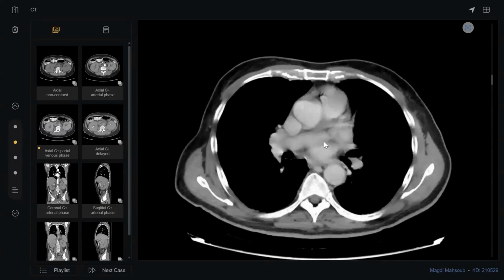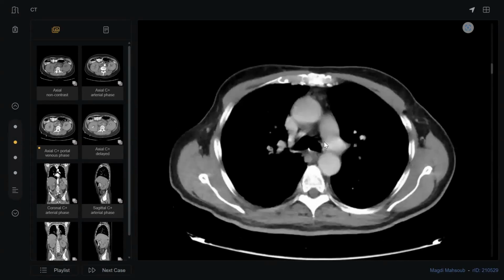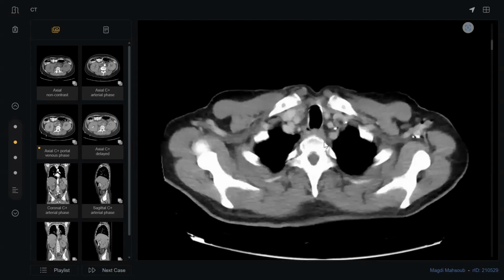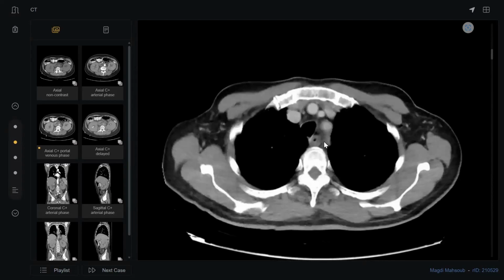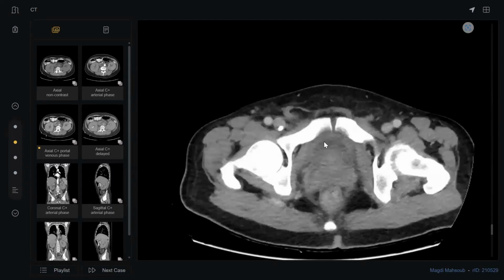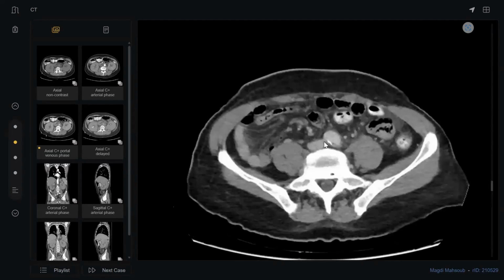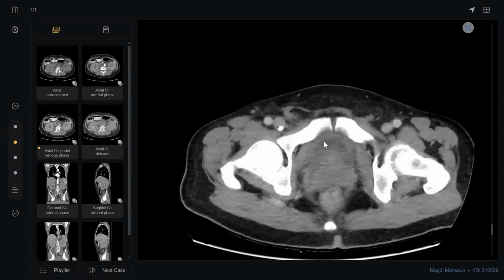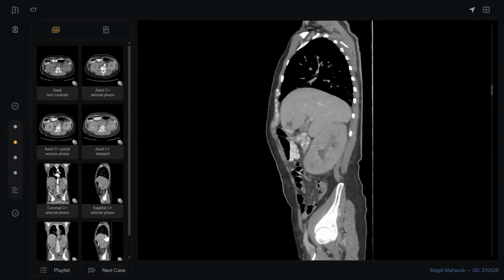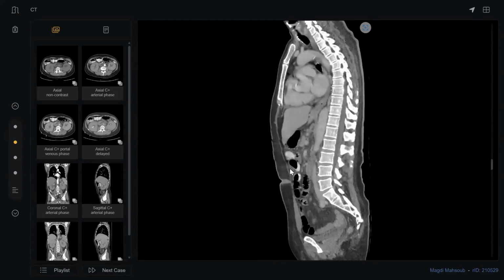The liver and the spleen show no metastasis. Even the lung shows no metastasis. A tricky point here, my colleagues: this is not an abdominal-only scan. This is chest, abdomen, pelvis. So be aware, please. This is what we do in cancer cases or oncology cases. Sometimes the technique will inform you something about your differential diagnosis. Thank you, doctor, so much.